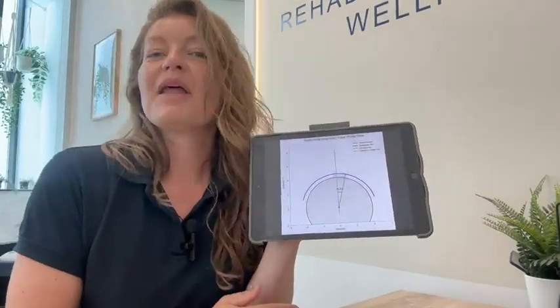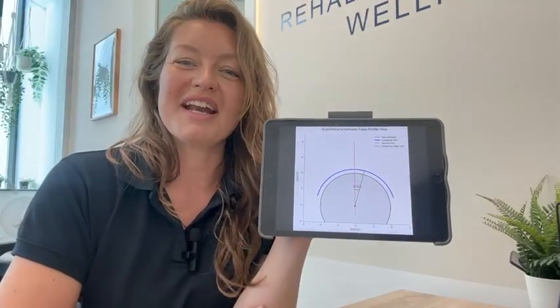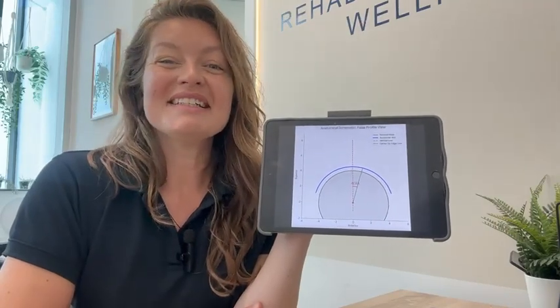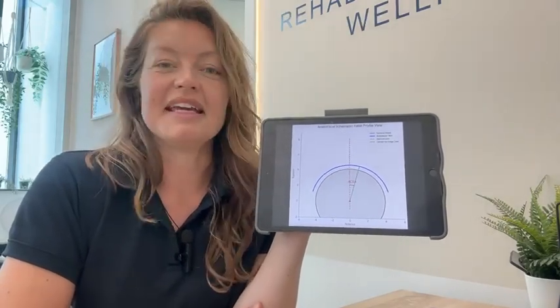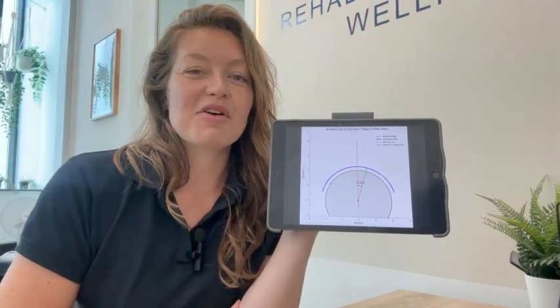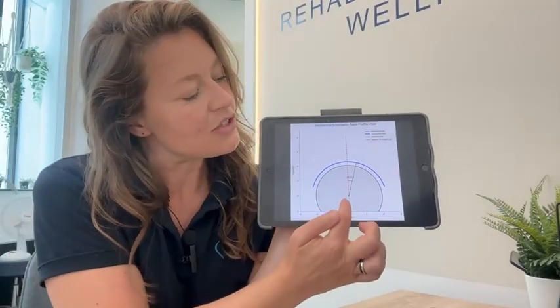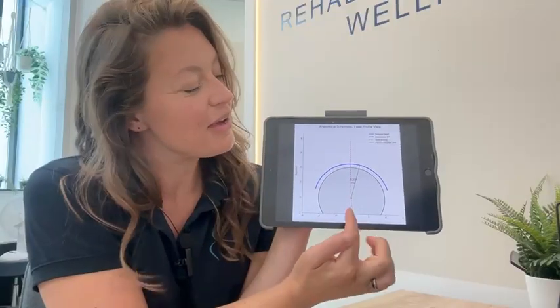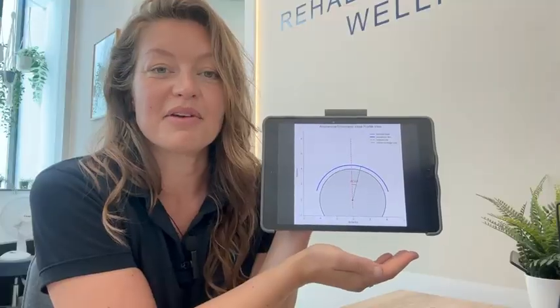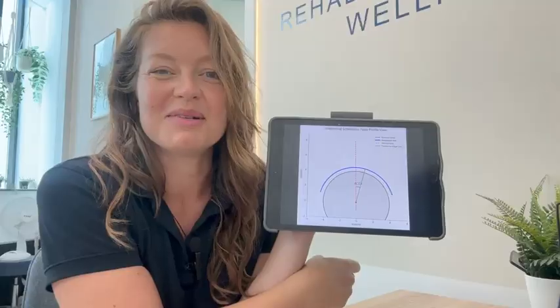So in this diagram here, we're imagining that that X-ray has been taken from the side in what we call a false profile view on an X-ray, and it looks like the same diagram. Essentially, it's very, very similar to the lateral center edge angle, but because the X-ray has been taken from a different angle, it's giving us different information. So it's telling us how much coverage we have front to back over the head of the femur. So again, the line is drawn from the center of the head of the femur and drawn straight upwards, and then the line is also taken to the edge of the acetabulum coming forwards, and that line will be drawn to that edge and that angle determined between.